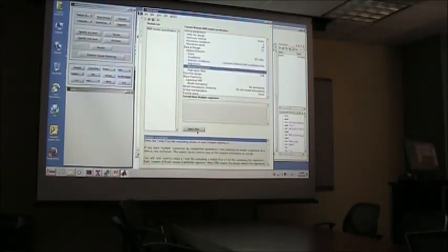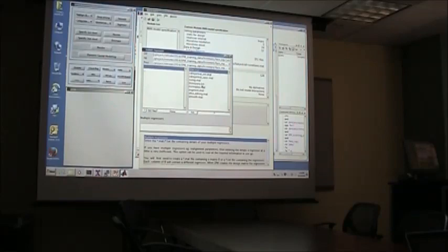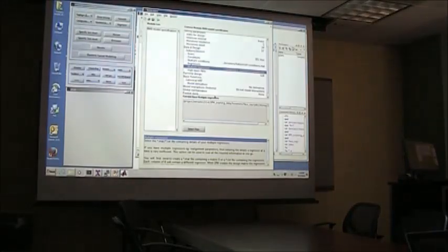And I'm also selecting here the movement parameters, which I mentioned is the second part of your model. In many cases, you're not only including in your model the stuff you're interested in, like the onset of the stimuli, but you also want to correct for other factors like movement. So SPM outputs these movement parameters, and you also include them in your model.